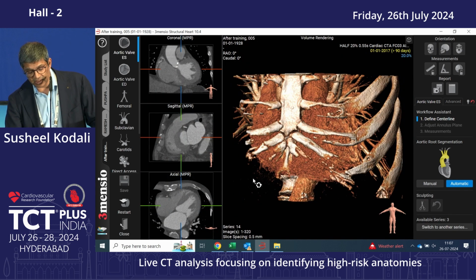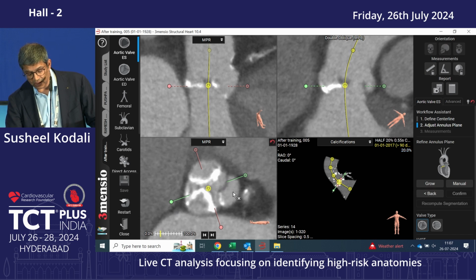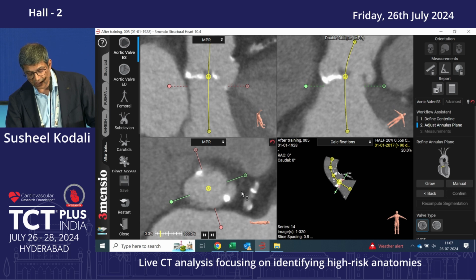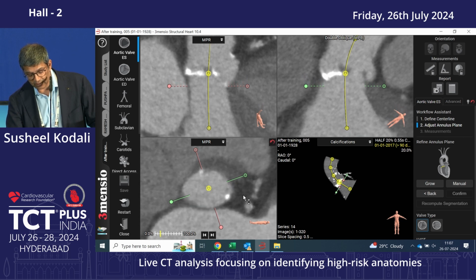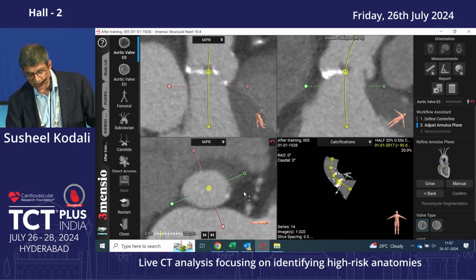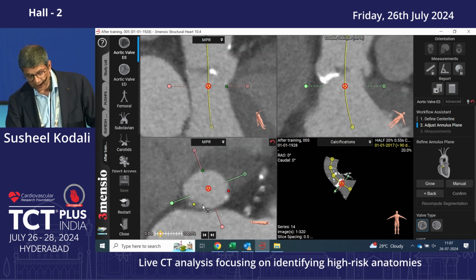The other way that people often do it is slightly different, and each is fine. On this screen, they go down until the right cusp disappears. I'm going to make this uneven. That cusp disappears and I put the dot right there. I scroll up again until this cusp just disappears, put the dot. Scroll up until I see this cusp, and where it just disappears, I put the dot. And you do the same thing.